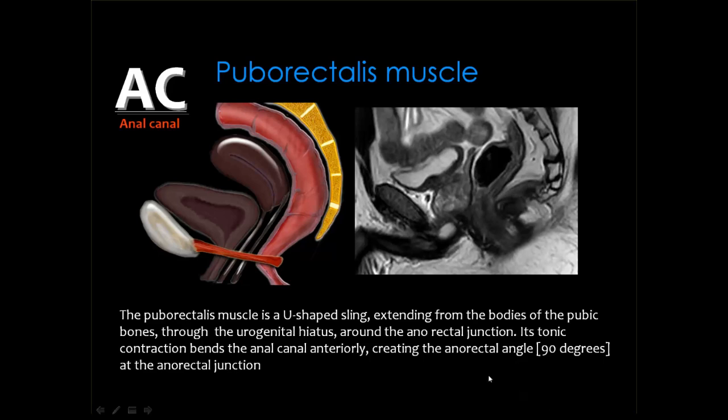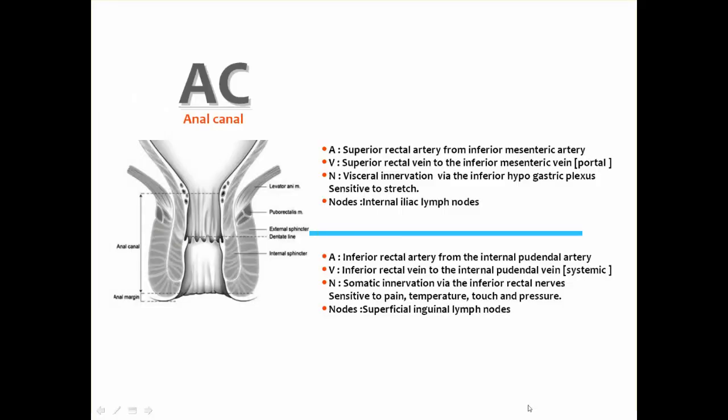And the sagittal images are very good in evaluation of the extent of the disease below the levator ani or above, since the levator ani separates the peritoneal cavity from the perineal area. Then this is the plane of the suspected course of the puborectalis muscle, which separates the peritoneal cavity from the perineal area.